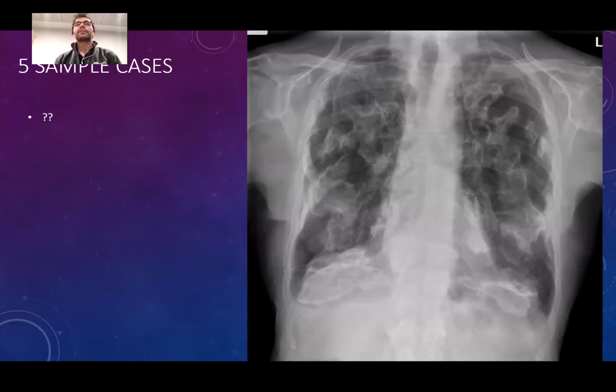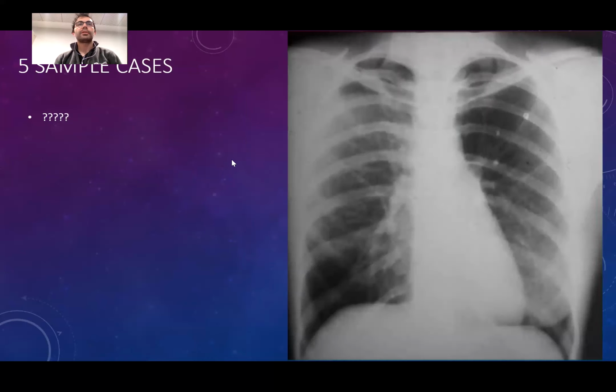And what about this one? These are asbestos plaques. There are pleural plaques. Okay. What about this one? This doesn't have an explanation. You have to do it yourself.